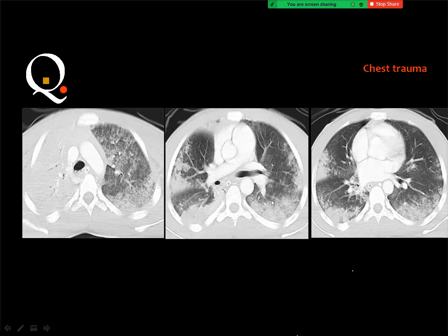Many times in the exams, they provide cases like this where you can notice a small rib fracture on the right or in the left. And they will not give you the history because the history is seen in the film. And if you are, let us say, intelligent enough, then you will see the rib fracture and you say that these are pulmonary contusions.